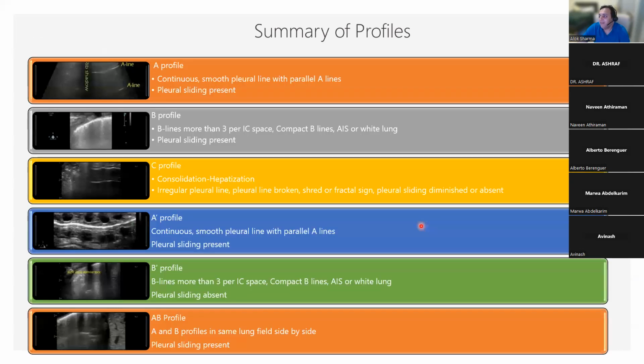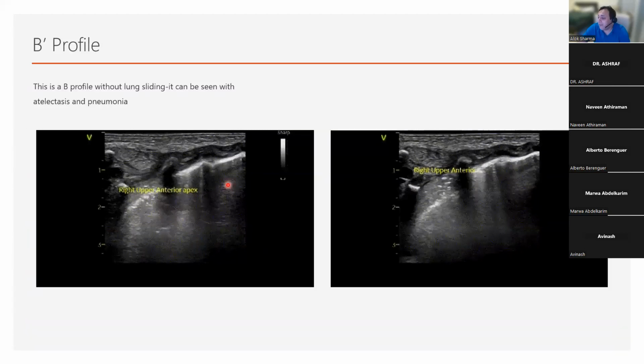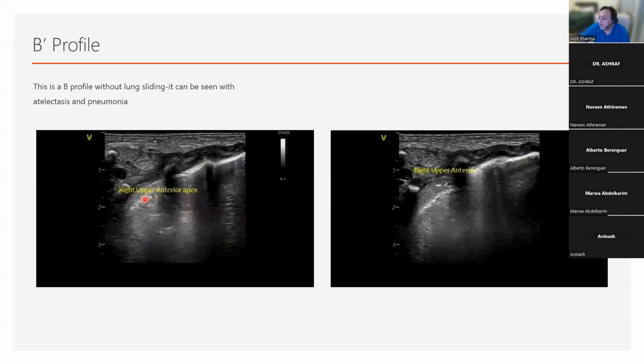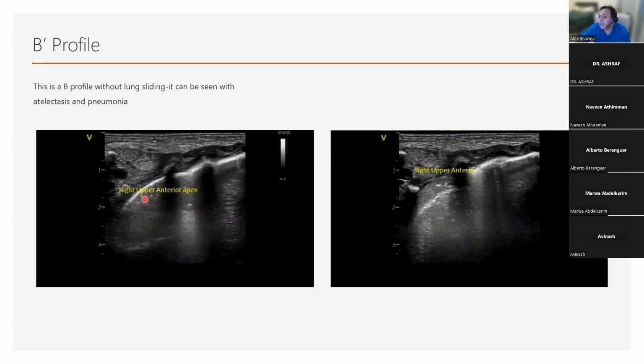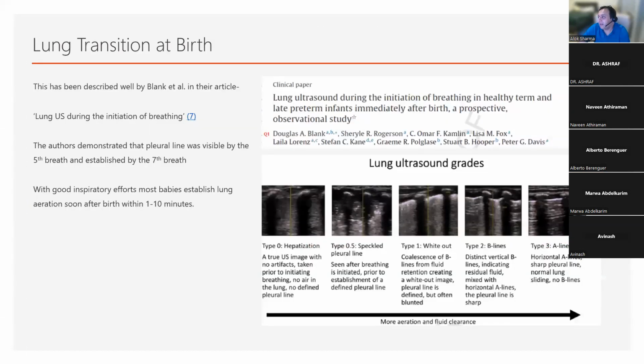On the other hand, if I'm seeing this kind of profile where lungs are still quite collapsed, atelectatic, with a tissue profile at birth, in a baby who's vigorous and crying, if I've done this at 30 minutes and this baby's FiO2 is improving and it's a cesarean section, I need to give him more time to recruit. I might well decide to screen and start antibiotics. But if this then transitions in this manner in 2 or 3 hours, then your retrospective diagnosis in this particular situation would be normal lung transition or transient tachypnea of the newborn. And that's why clinical correlation is key.